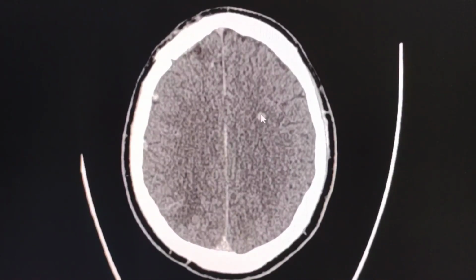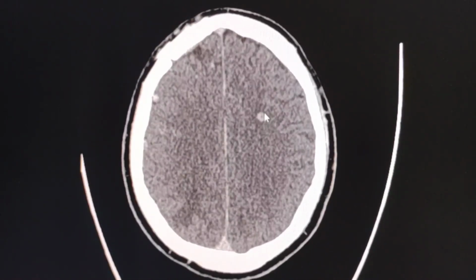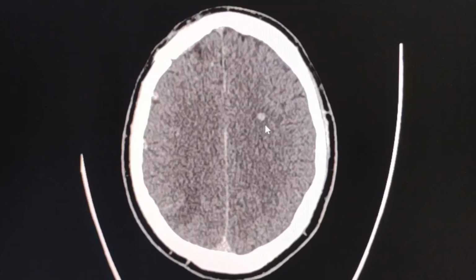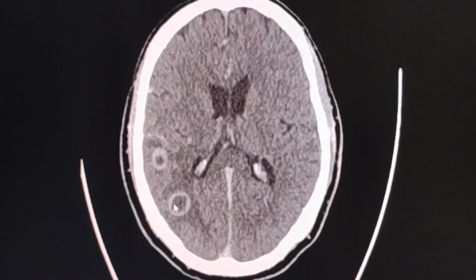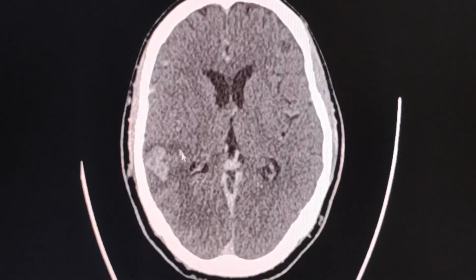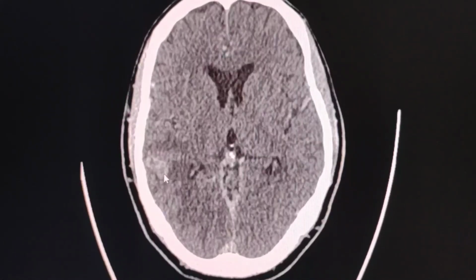Here is another one, an enhanced lesion surrounded by mild edema. Here is another one which is slightly larger, and here a multiloculated lesion.